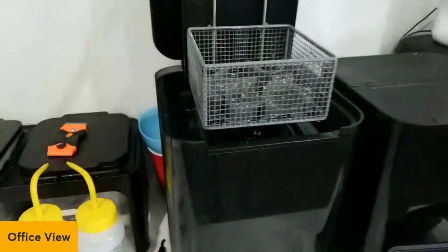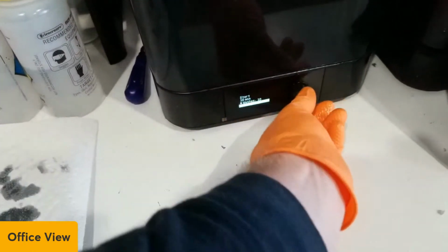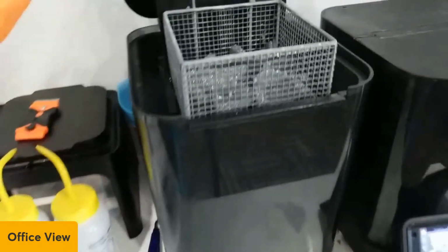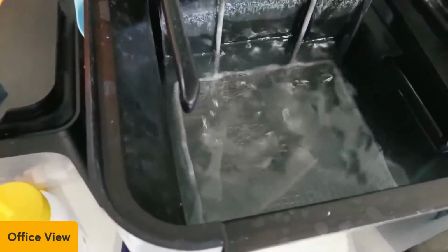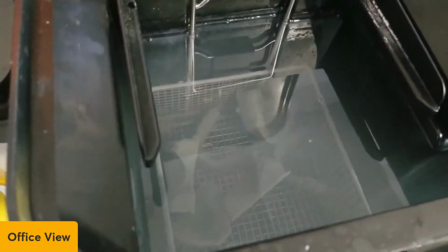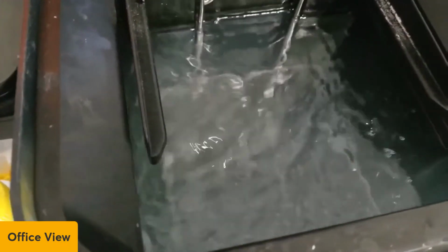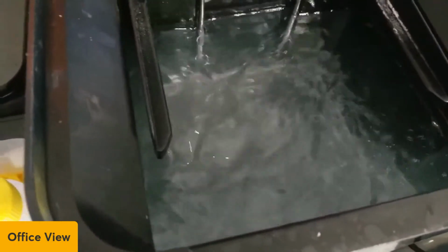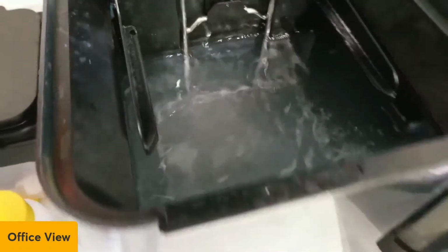So then I have that set for 10 minutes. I'm going to hit start. I'm going to rotate this to start and push the button in. And that's going to sink down in there. And then that propeller at the bottom will start spinning vigorously. So it starts washing it. All right. So it does one clockwise for 2 minutes, and then it does counterclockwise for the next 2 minutes.